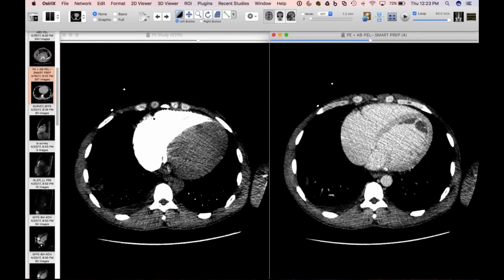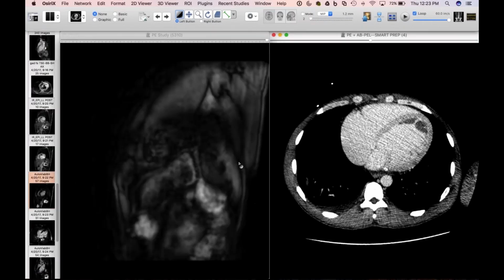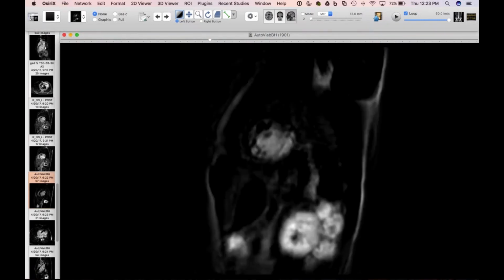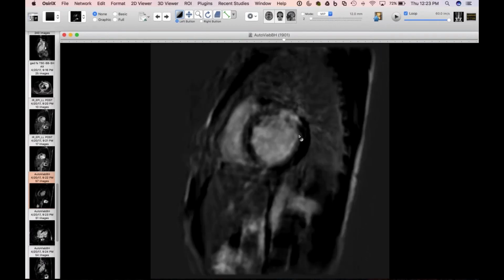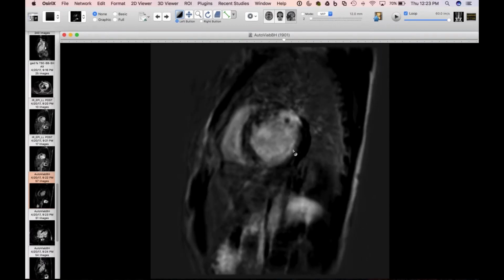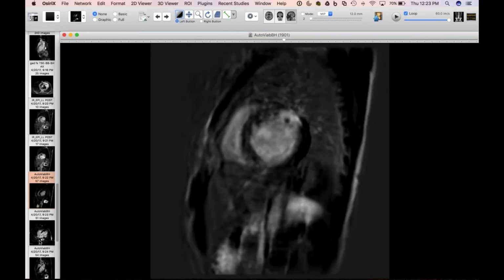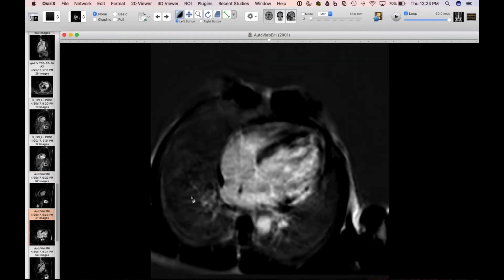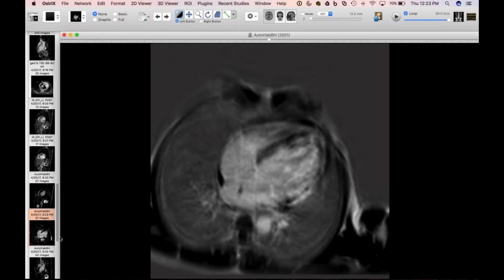Now, to the question of his cardiomyopathy, I'm embarrassed to show the MR images because our MR scanners are not quite as good as what Seth shows, but he has some subepicardial enhancement too. And there's some various areas where he has this. And I think that he probably has some sort of myocarditis. I don't know, Seth, do you ever see just a primary HIV associated myocarditis?